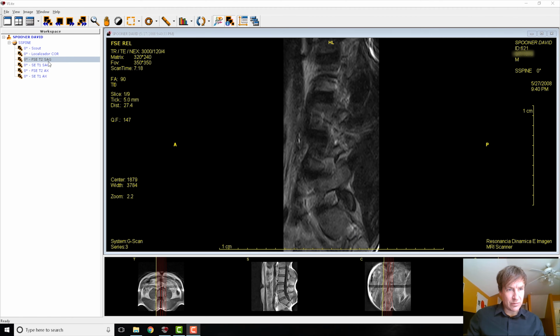This is 10 years worth of MRIs and the back history that I have. So let's get started. The first MRI I have is this one from 2008. Yeah, so I got it pulled up here and we're just gonna cycle through from one side of the images to the other. Here we go.